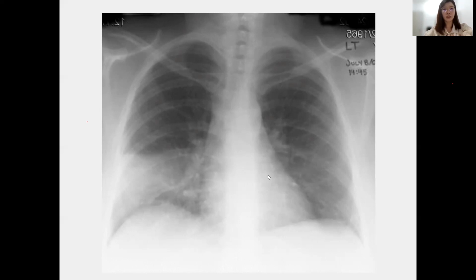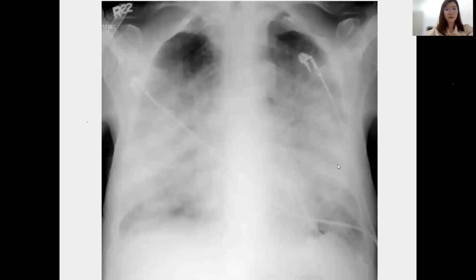Okay, never mind. But when you say opacity, you will really look at this kind of whitish opacity rather than a vague one, where there is or there is not. Okay, when there is, there is. Okay, these are bat wing.